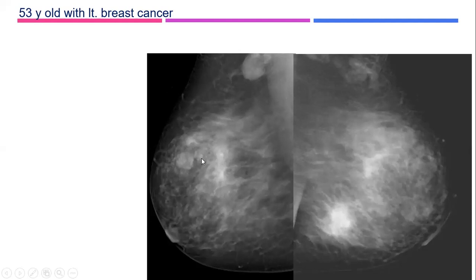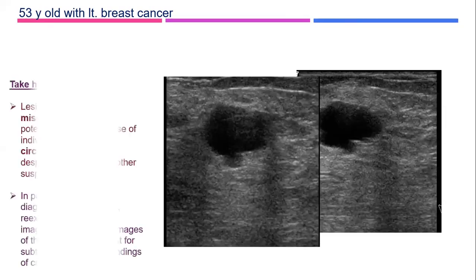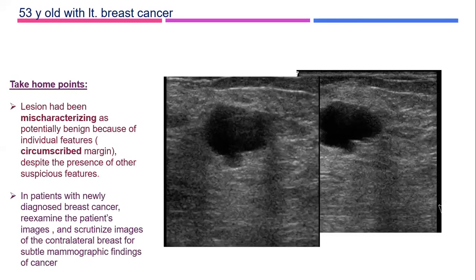Yeah, really, I mischaracterized. I picked up the abnormality, but I mischaracterized it. You see, I misinterpreted it. Because it was echo-free, I couldn't recognize this lobulation. At that moment, I was not concentrating on that area. Retrospectively, I have looked at it, you see? And even if you look at it, this portion seemed to be hypoechoic rather than echo-free. Might be this is a cancer adjacent to a cyst or presenting as a cyst.